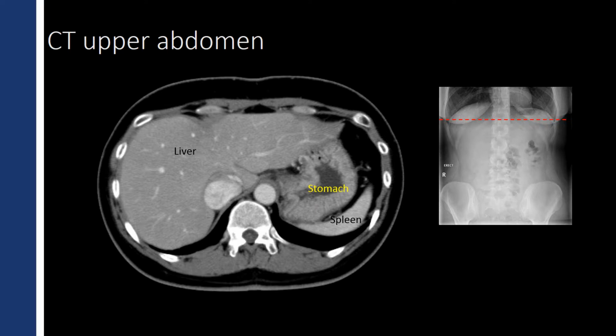Now, these little slips of muscle posteriorly are the diaphragmatic crura. Crura is plural, crus is singular, and these are just the leading edge of the diaphragm. This is what's going to attach to the posterior abdominal wall to separate the abdomen from the thorax. Running down just to the left of midline, adjacent to the vertebra and retrocrural, or posterior to the crura, is the aorta. Now, to the right of midline and anterocrural or precrural, surrounded on three sides by the liver, is the inferior vena cava.